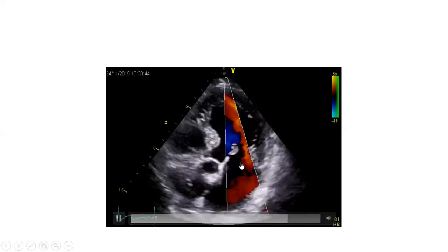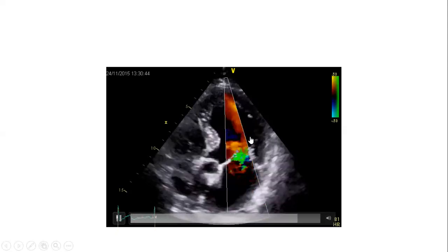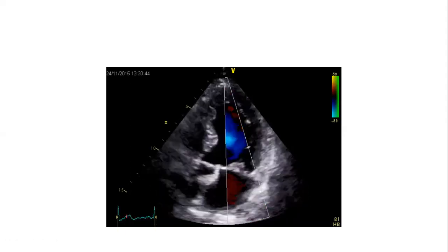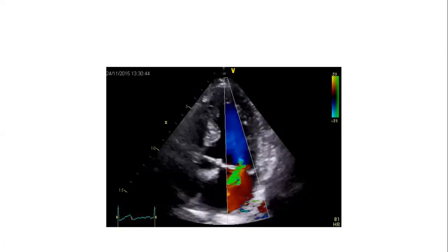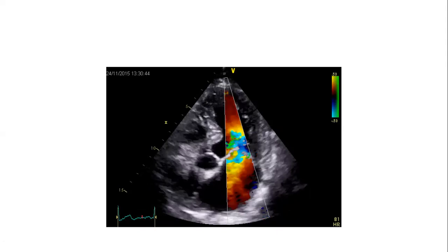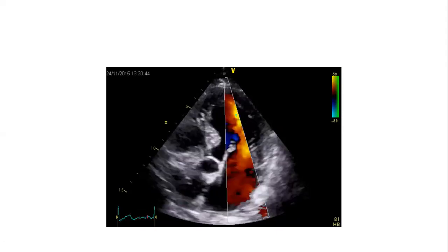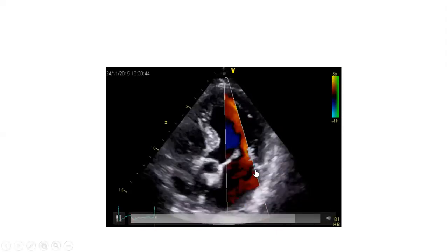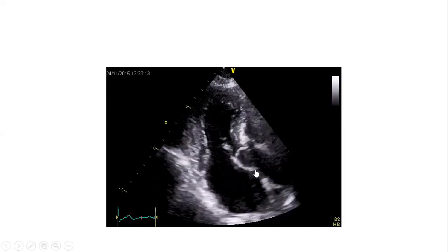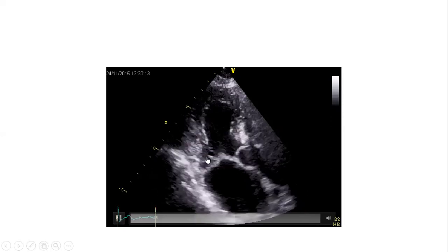Now, sometimes we look at only mitral regurgitation and try to find why this mitral regurgitation is there, because the valve is normal and wall motion abnormalities are not there. That is occult ischemia. So we ask the patient to walk for a certain distance, and MR increases and wall motion abnormality across basal inferior posterior lateral wall appears. Now let's see this pattern again. This is again basal inferior, basal posterior wall.